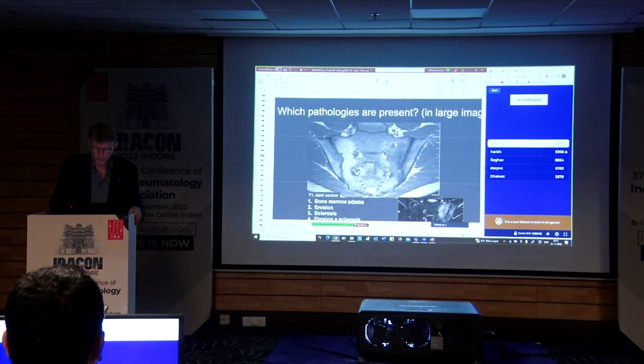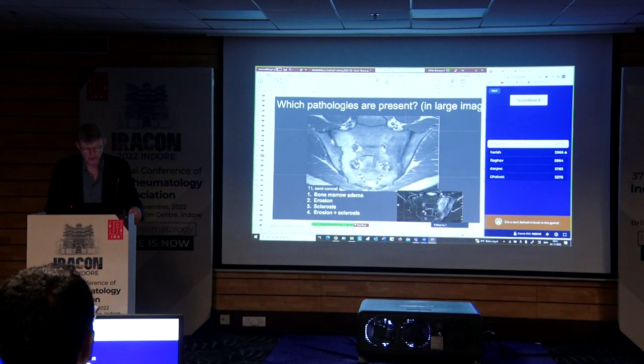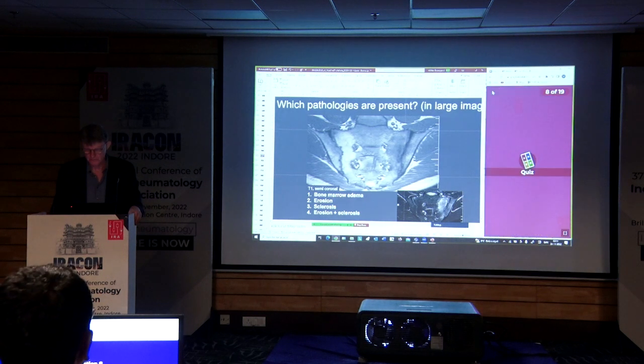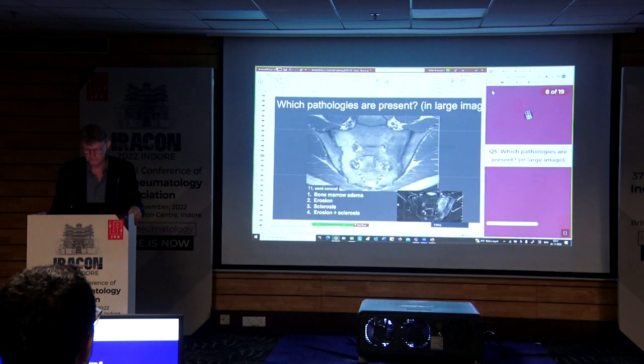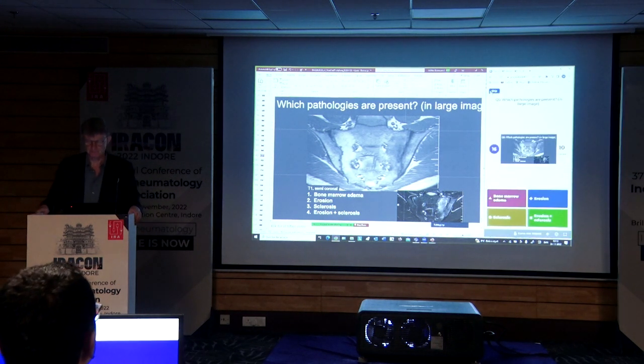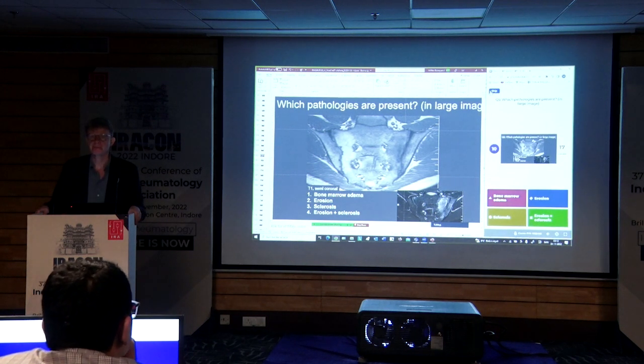So now we actually do move into a T1 weighted image. So this is the corresponding T1 weighted image, and you should only look at that one, not at the STIR, which is just down here to illustrate it's the same patient. And here you have different options. And now you can go. And you have 6 seconds left.